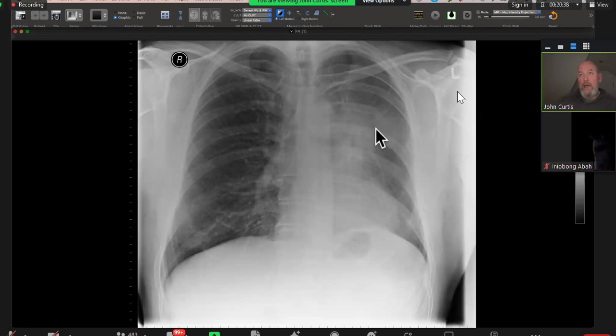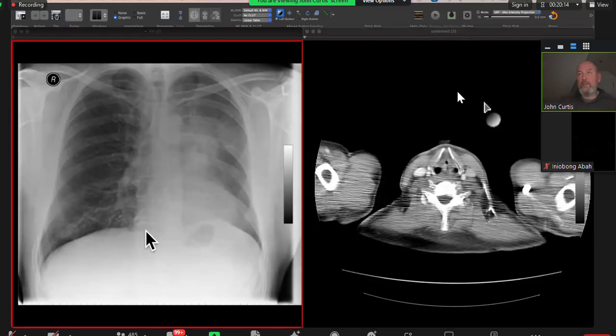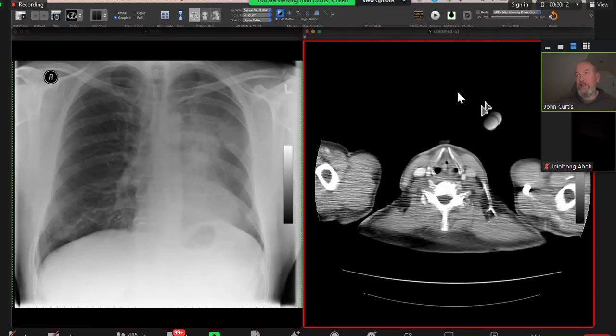And see how different that is from the schwannoma, which was eroding the undersurface of the rib, which was scalloping the rib. This is actually destroying the rib. You can see the rib, then it's gone. You can see the rib, and it's gone. Yeah. So that patient's got a rib lesion. I didn't show you the CT, but I'll just show it to you for effect.